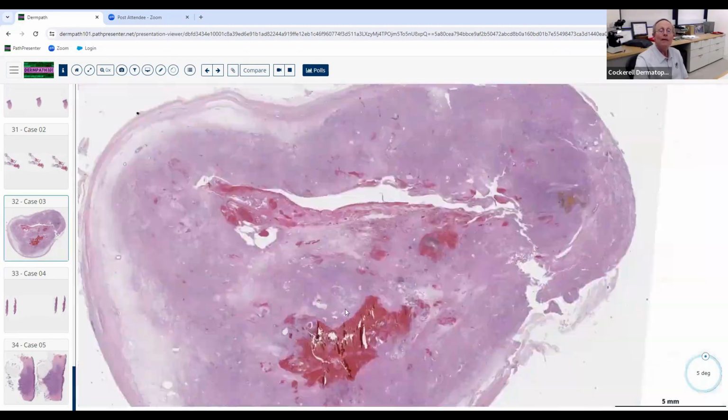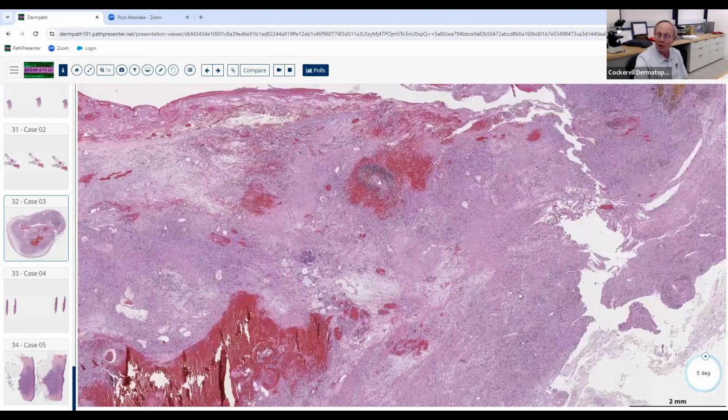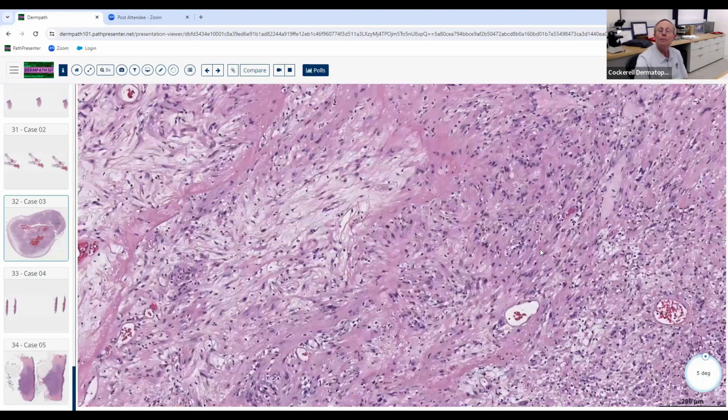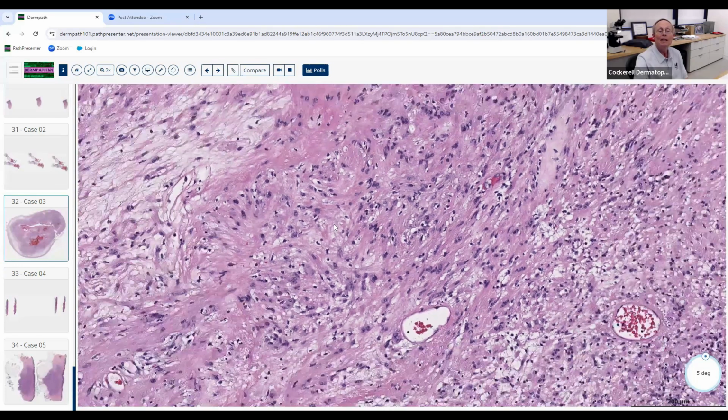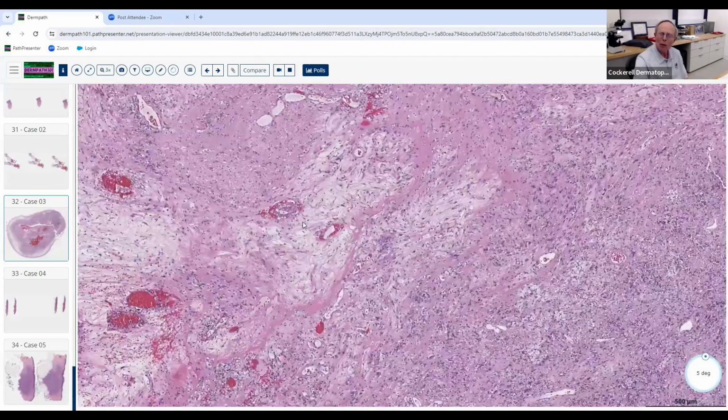These usually tend to be more cellular than a neurofibroma. They'll often have this pink, more cytoplasm. You know, these are maybe a little bit S-shaped. Just goes to show you that that's not perfect. You have to look carefully to find some of it that you can convince yourself are S-shaped. The stroma is more myxoid than neurofibroma.